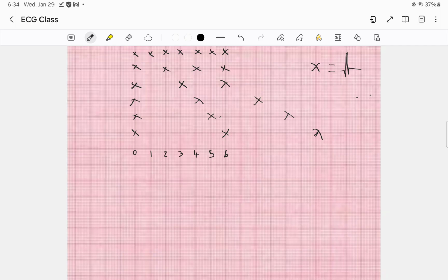Of course, I didn't say this earlier, but I can say it now. If you have something like this, and it's regular, but some don't line up exactly, it's easiest to try to find 2 that line up on a hard line.